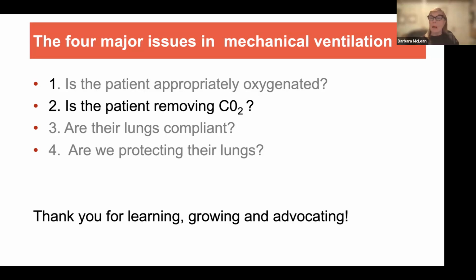I hope this has been helpful to you. The simulator I'm using is not mine. It's the X-Lung simulator. It was actually developed in Spain. It's available for anyone who wishes to purchase it. It's an annual fee. I won't share how much that is. You'll determine whether it's worth it to you or not.